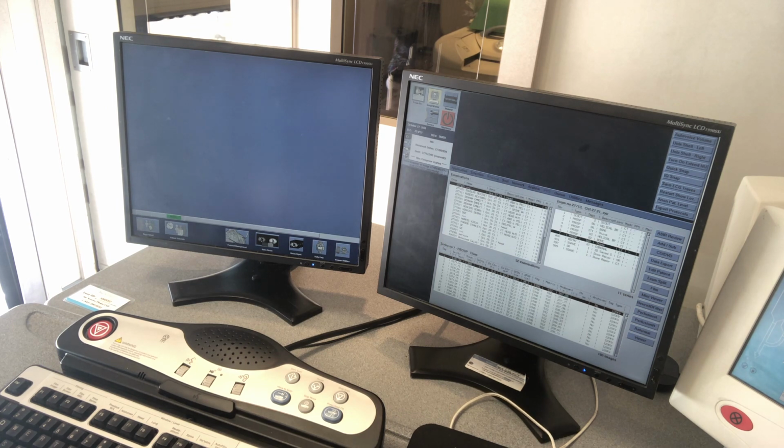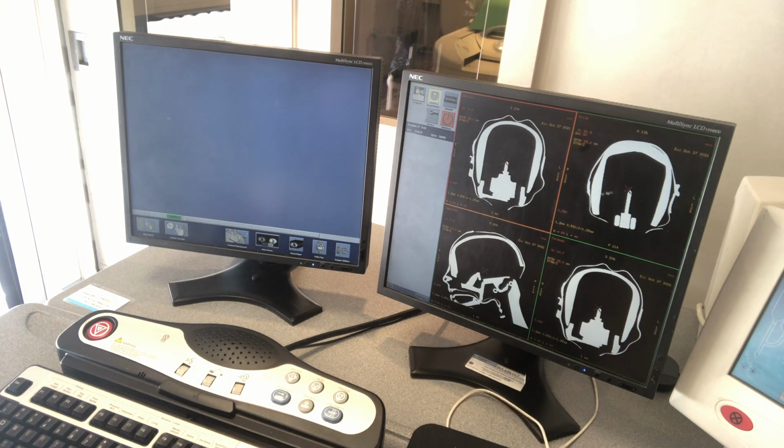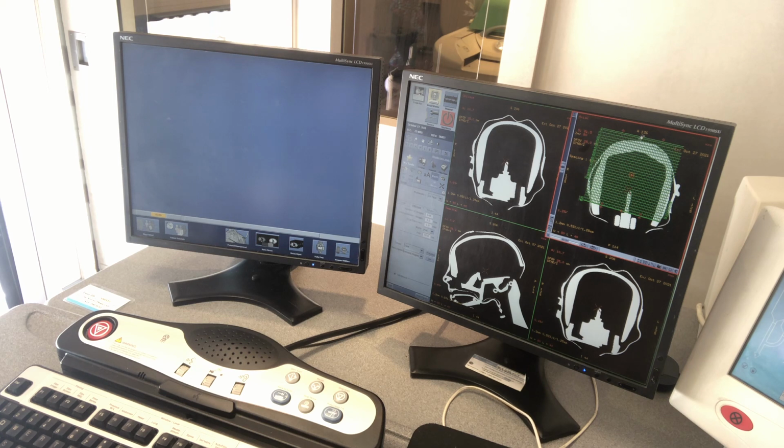So we're going to take our thins and redo the sagittals. Good thing they need to know to not take for granted that. Always check and make sure your images are there, like your sagittal and coronals. Just like ours was not, so we got to rebuild them. So we're going to go back to batch. And since it is sagittals, we're turning our box.